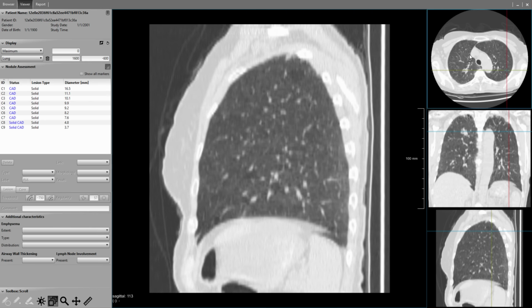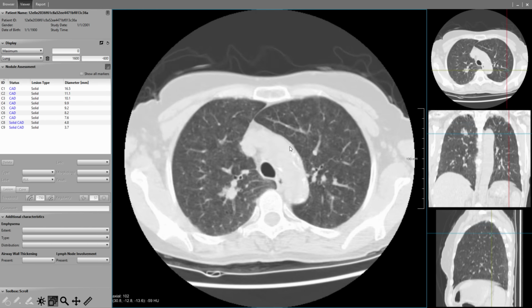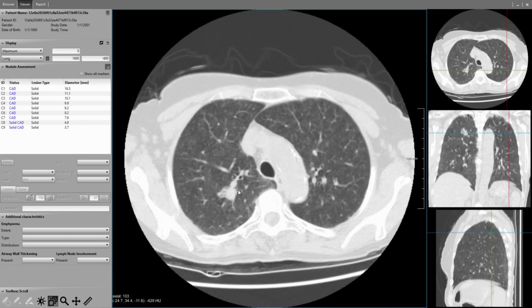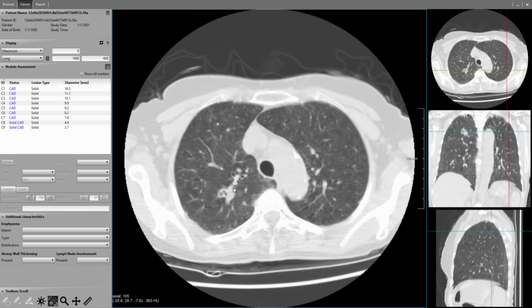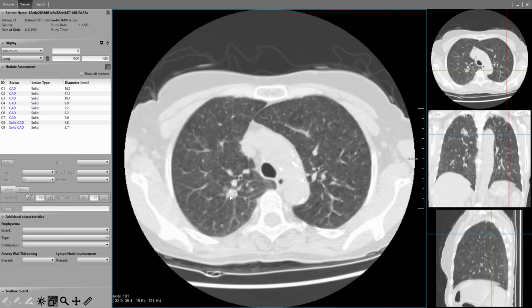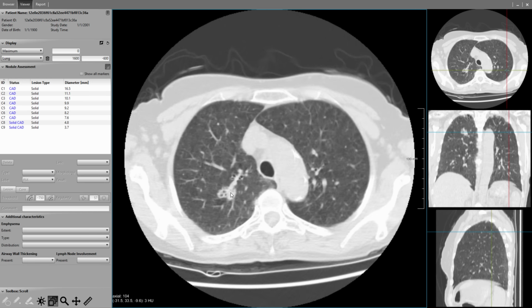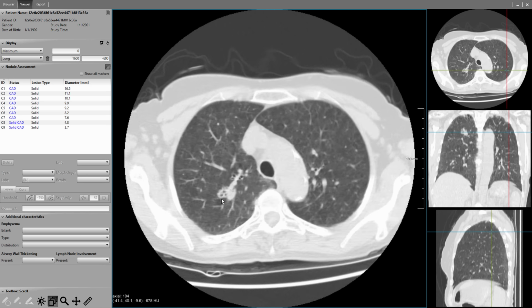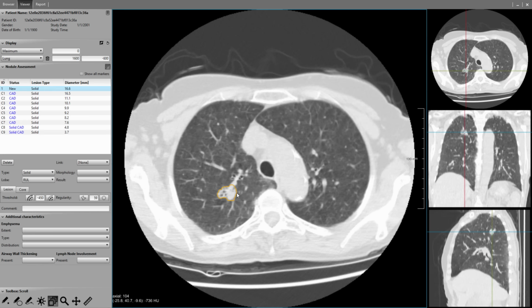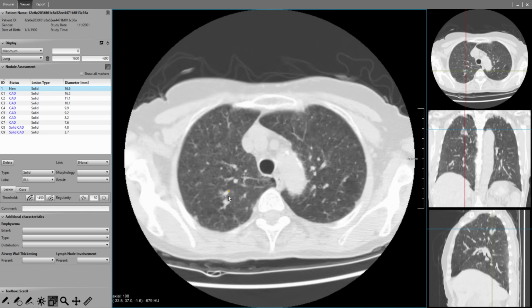So let's switch back to the axial view, and here I notice something that really doesn't look like a vessel. It's too big. If I scroll through it, this is a vessel which I can follow, see it branching, but this thing is not a vessel. And this structure here are not airways. Of course you see also airways in the lung. This is an airway that you can trace. But here I see three things in this bigger region that are apparently air filled, and that make this lesion even more suspicious. I can double click on this lesion, get a segmentation from the computer.